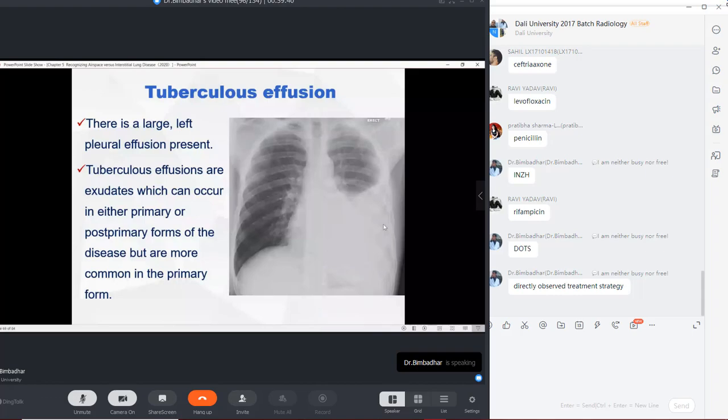This is not related to pneumonia of the lower lobes because it will not have regular borders, it will have a hazy density, but you look at this patient, it is not having hazy densities. It is well demarcated. And now you see here, there is a curve here. This curve is actually indicating the fluid level.